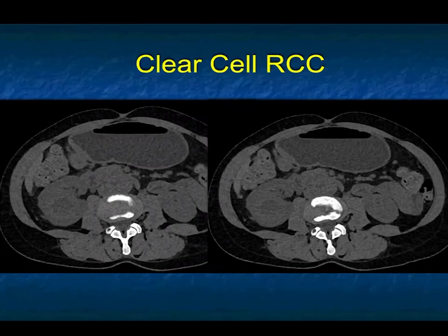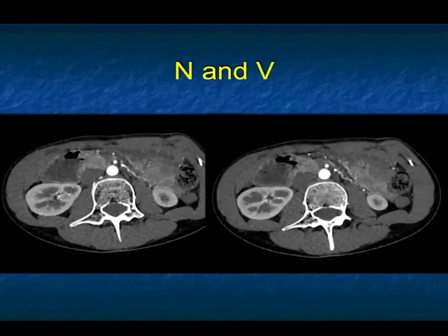Again, you want to be careful. It also shows how easy it might be to overlook this lesion on the non-contrast scan.